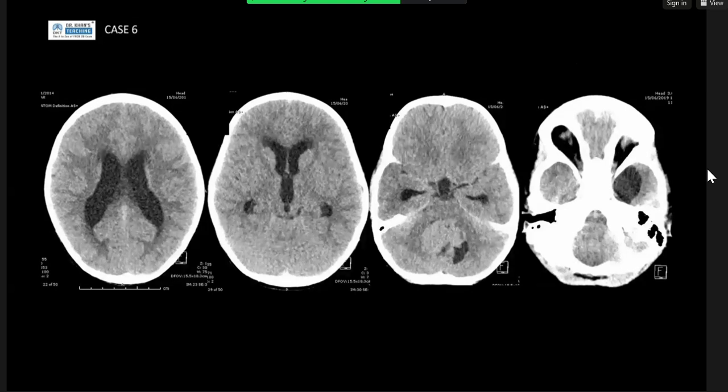I have been provided with multiple sets of CT images. There is hydrocephalic change seen, with dilated temporal horns. There is a posterior fossa space-occupying lesion confined to the region of the fourth ventricle, slightly hyperdense with a heterogeneous outline, hyperdense compared to the brain parenchyma. So this is a case of medulloblastoma with hydrocephalic change. Need urgent referral to a neurosurgeon for shunting to relieve this hydrocephalus.